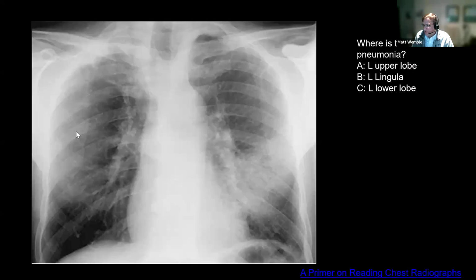Okay, so where is this one? Okay, looks like 11% left upper lobe, 72% left lingula, and 17% left lower lobe.